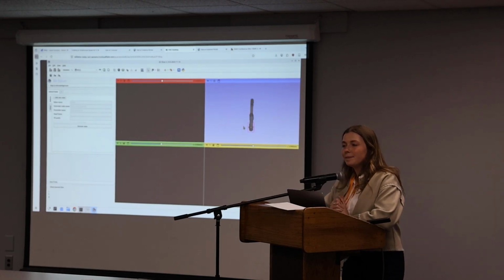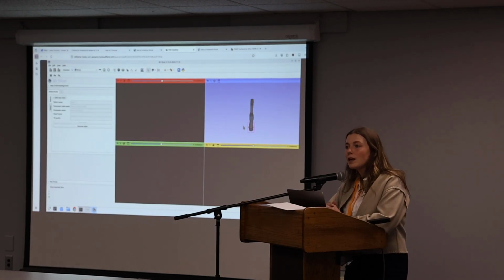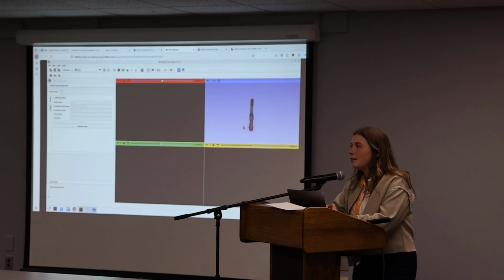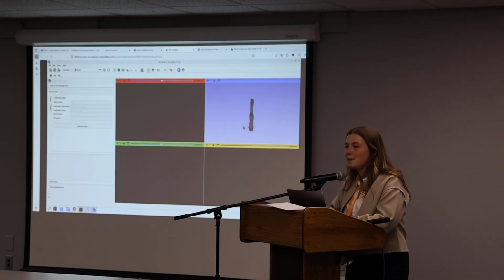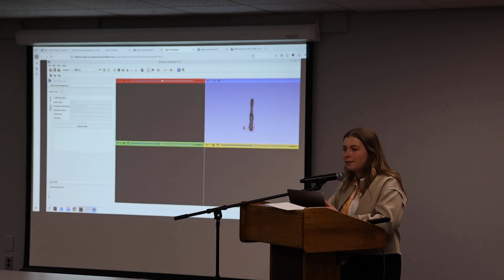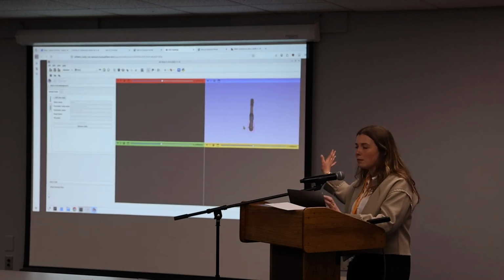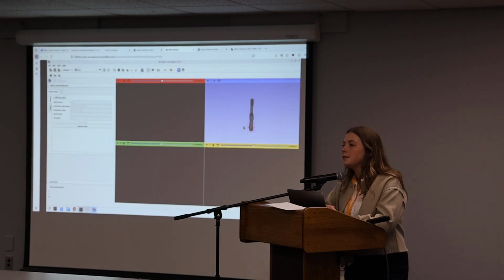And do you know how the DAE stuff works with the URDF? So you're not using an STL anymore? Yeah, you used to have to modify your URDF to have an STL. We linked it against this package called ASSIMP, which is kind of funny. So now that's built in, and you can just use your URDF. If you have a robot with a robot state publisher and you can see it in RViz, you should be able to see it in Slicer too with no changes.